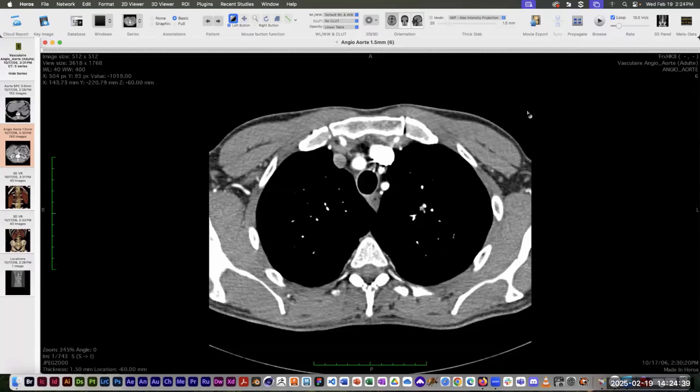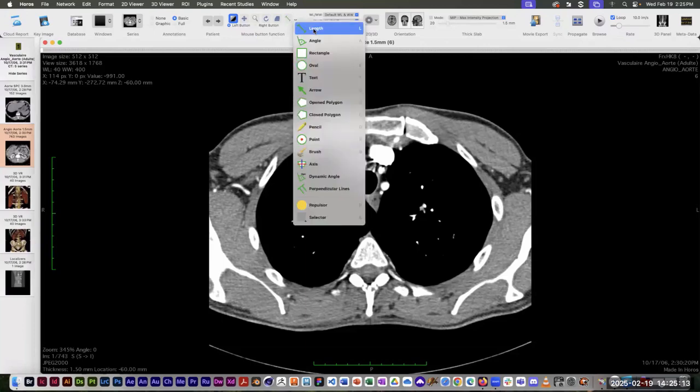So the first way of doing segmentation in Horos is up here in the menu, and because now my, can I hide this thing? Yeah, right. Up here in Horos, there's a little button here. It looks like a little green capital letter I turned on its side. I think that's supposed to be a measurement tool for measuring length.